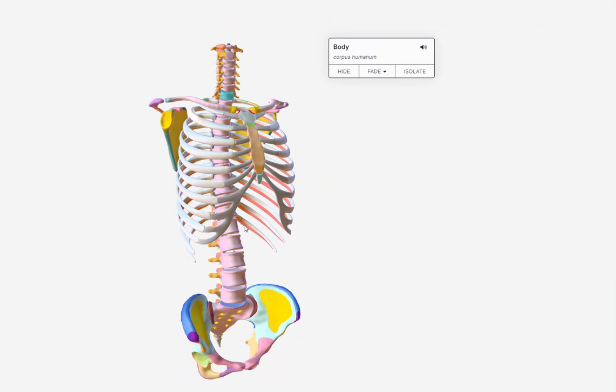Now the left ribs are elongated. Look at that. The left ribs look straight now. They don't even look curved anymore. That's how it's going to look on our x-ray. Left ribs elongated. Left ilium is also elongated.